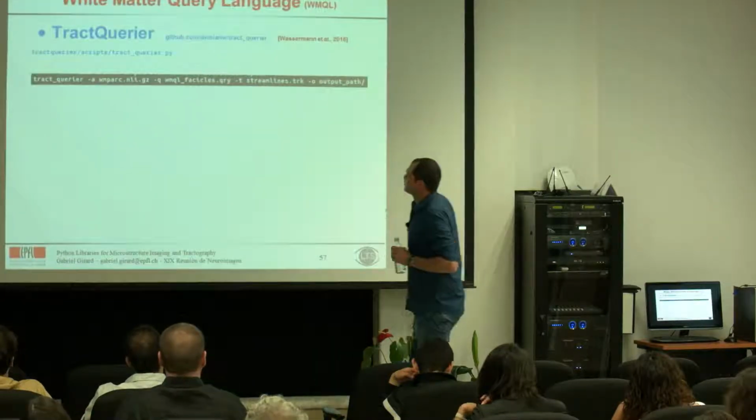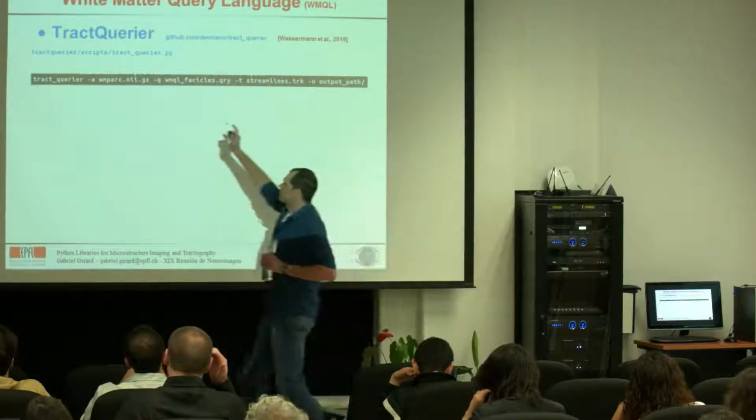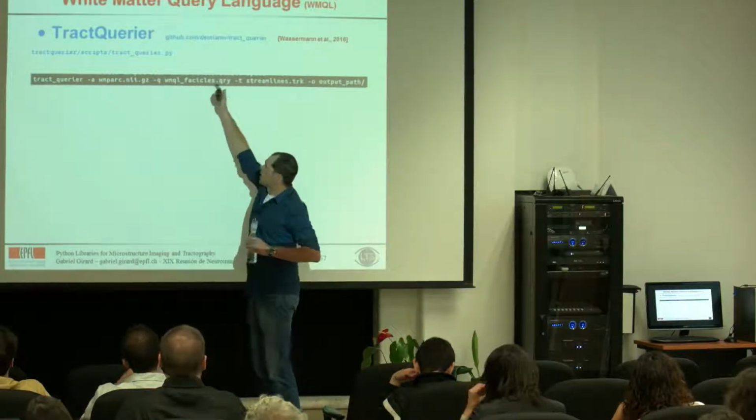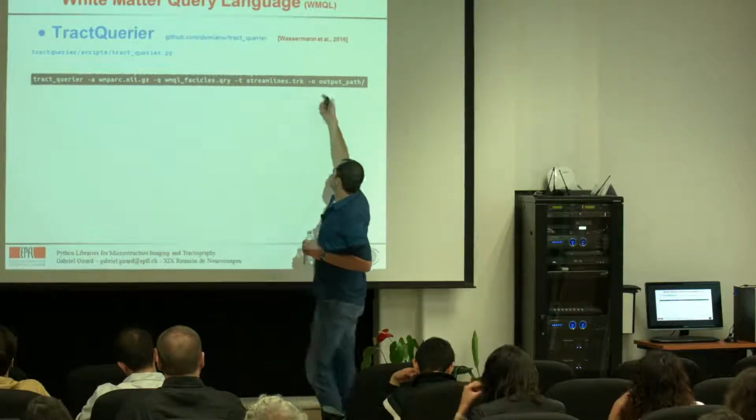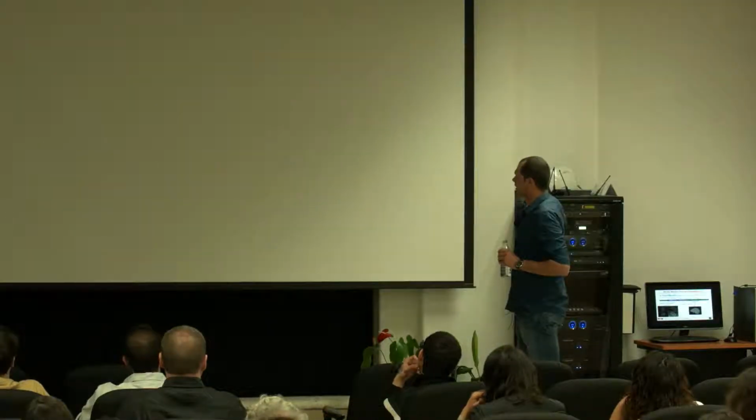Then you call this with the parcellation from FreeSurfer, your query that you have to define, and your streamlines. So parcellation, streamlines.